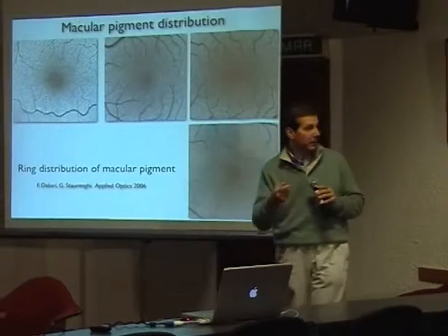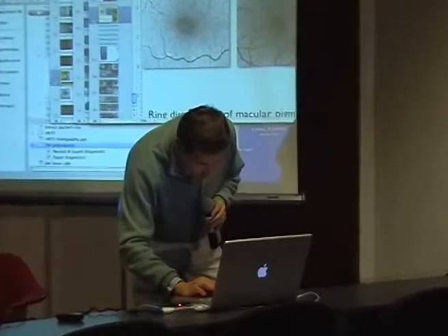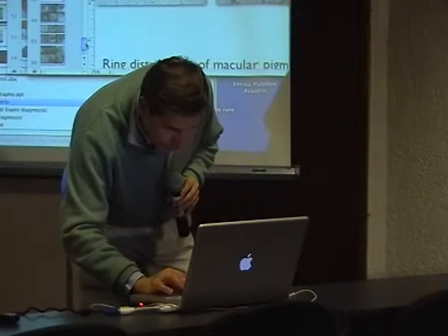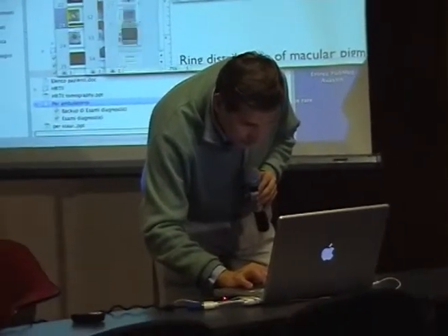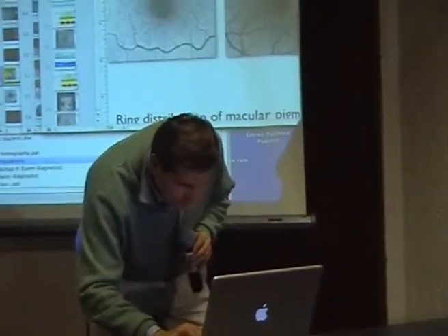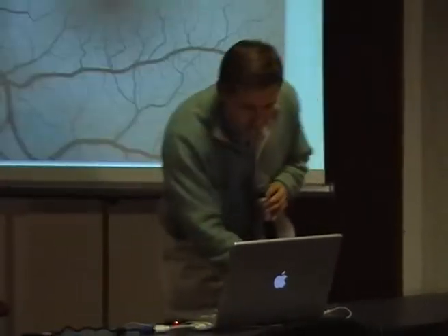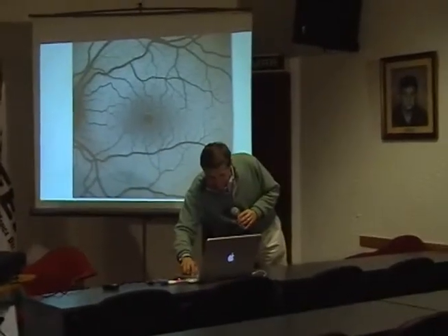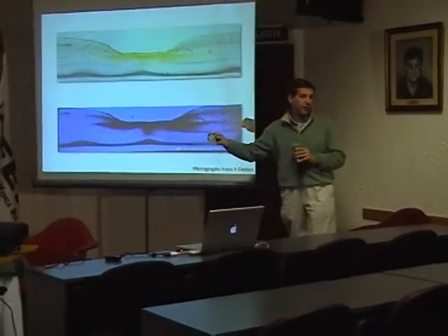It's not clear yet why. Okay, so the macular pigment is here, it's black, and this is white.